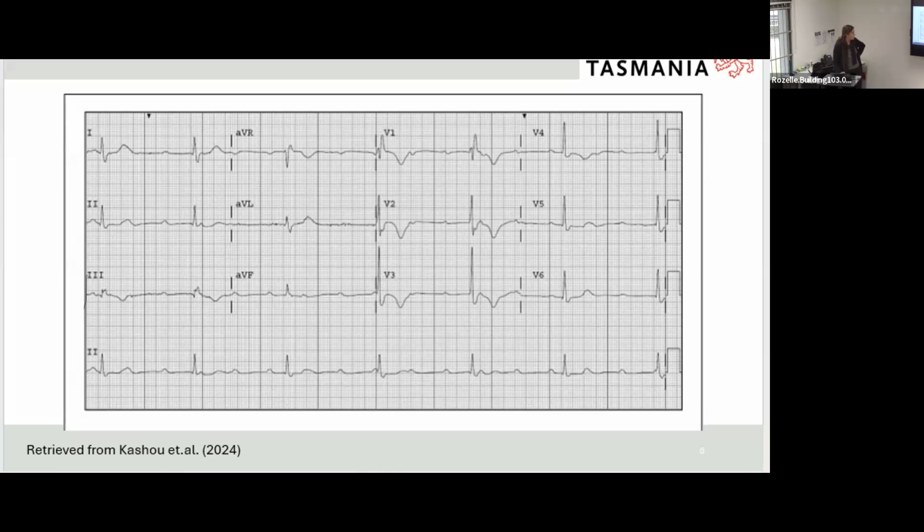1, 2, 3, 4, 5. They're about 3 big squares each. So QRS is 1.6, P is about 0.6. Amazing, thanks for the quick maths. Okay, so if our P waves are regular then, is it complete heart block? Yep. From Sam? Yep. From Jack? Yep, absolutely.